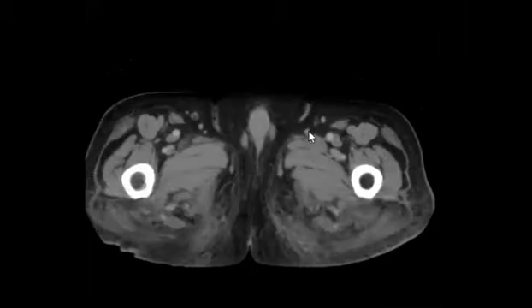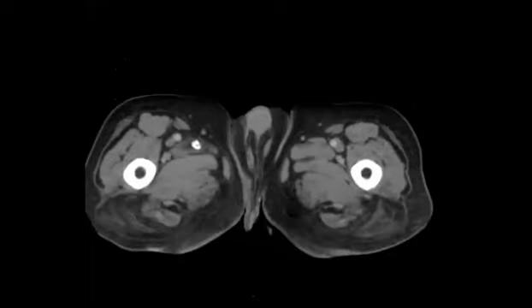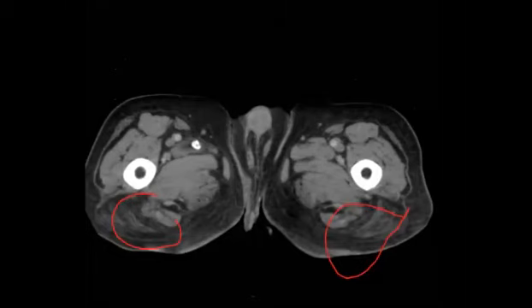If you have anything, you can collect the findings in the chat, and I want to see how many findings you can collect. I want to make this a competition, and we can give 10 stars to the one who collects most of the findings. I will show you this case in 3 stages. First the mediastinal window, then the lung window, then the bone window.